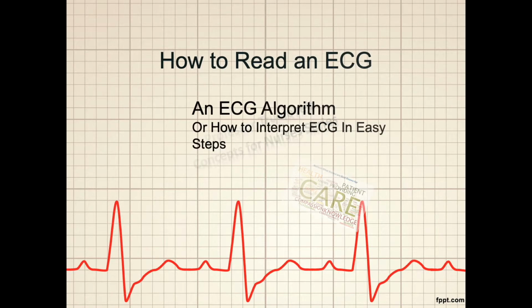And in this episode, we are going to cover one of the many ways of interpreting an EKG. I'm going to use a specific type of algorithm to help you quickly learn how to read these up and down patterns called the EKG. As I said, there are many ways to interpret this ECG. This is one that I think will really help you at the beginning.